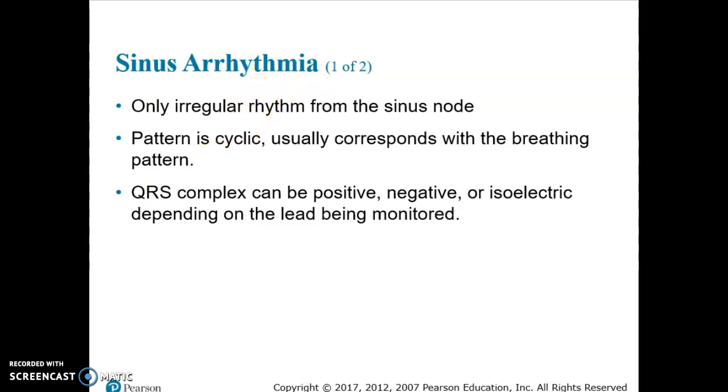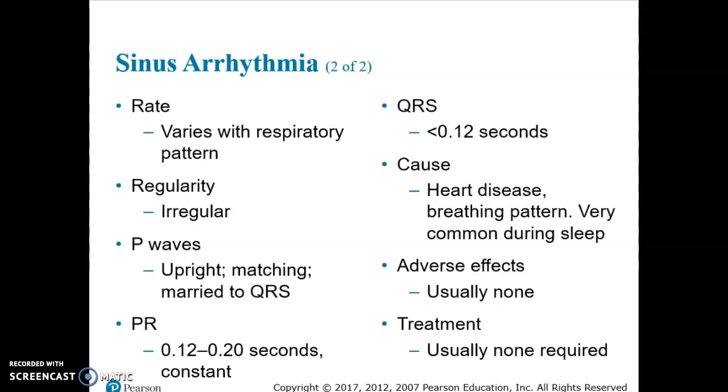The pattern can often be seen as cyclic. It usually corresponds with breathing. Again, the QRS complex can be positive, negative, or isoelectric. It really depends on which lead you're monitoring. And then here is your criteria. It's irregular in a regular pattern, okay?